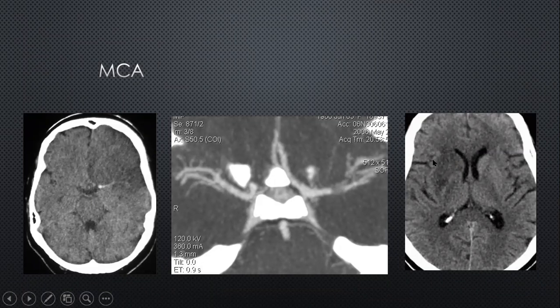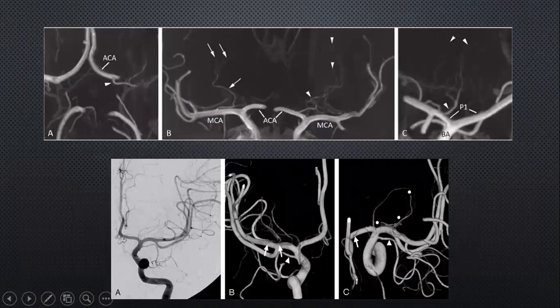And this is a patient with infarction developed as a result of occlusion of the lenticulostriate branches of those arteries. And again, on angiogram, we can see these perforating arteries. These are the perforating arteries which are arising from the MCA on the coronal views. On both sides, you can see how they perforate and reach quite high up, almost up to the level of the roof of the ventricle. And hence, if you have an AVM quite high up, sometimes you can see how they can be supplied by the perforating branches of the anterior and the posterior circulation.